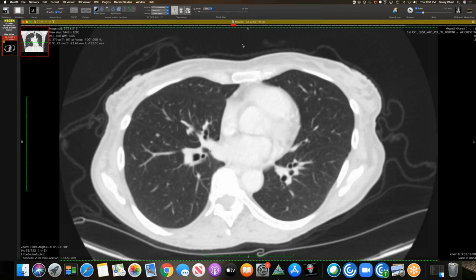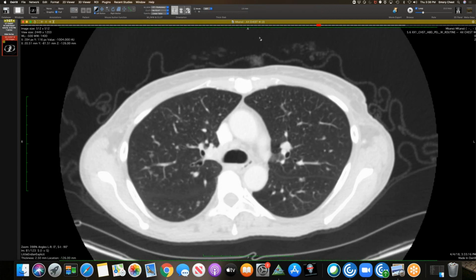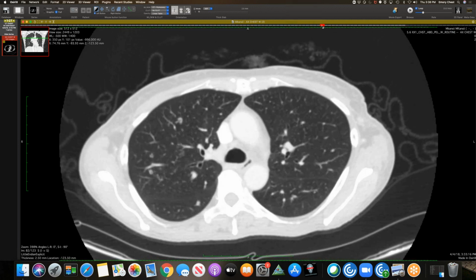This is a 59-year-old lady with heart failure, and this is her chest radiograph, and she has the new Impella device, which we talked about a few months ago. And one of my colleagues, Eugene Berkowitz, was reading this X-ray, and he noted this structure right here. It looks like it's following the contours of the ventricle. And we will show the CT here. So here it is. You can see it. It's basically right on the pericardium.